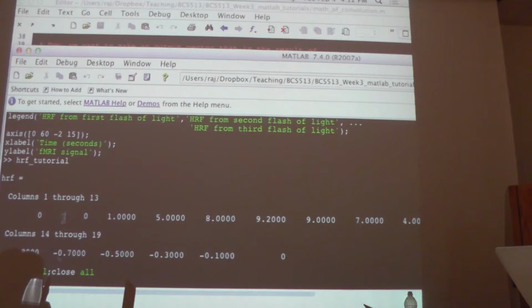So the end result of this convolution with a time course is a predicted time series. They're saying, in an idealized perfect world, if there was a canonical HRF, canonical just means kind of off the shelf, and if things added up together perfectly linearly, what would I predict? And then you could say, okay, now I have a bunch of predictors, and the jargon term for them in statistics and fMRI is regressors. But they're really predictors.